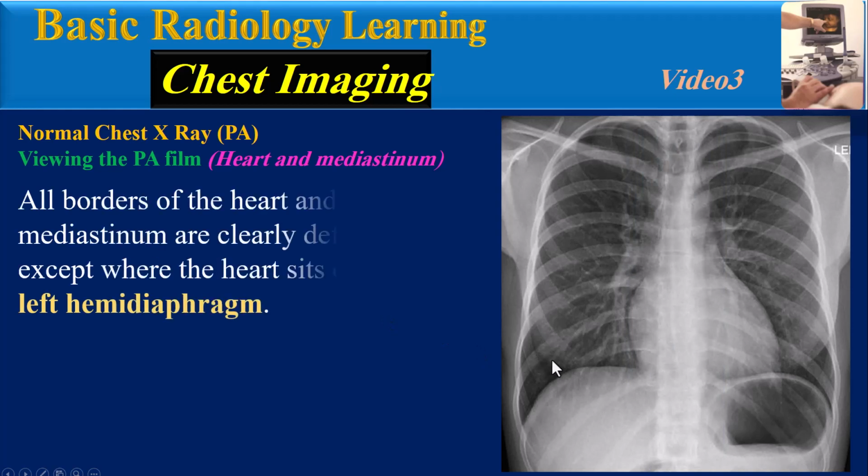All borders of the heart and mediastinum are clearly defined, except where the heart sits on the left hemidiaphragm.